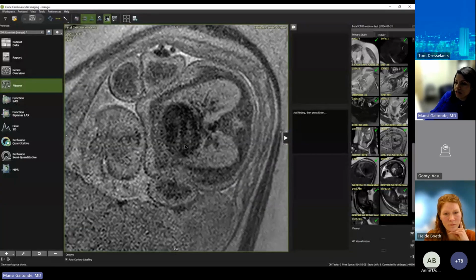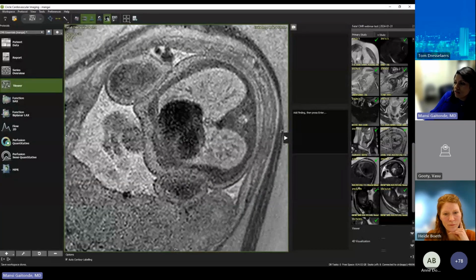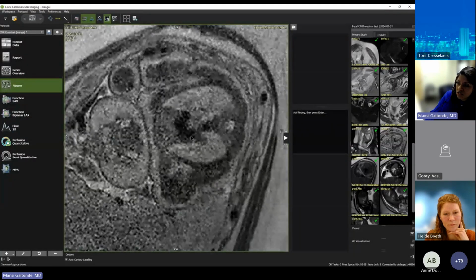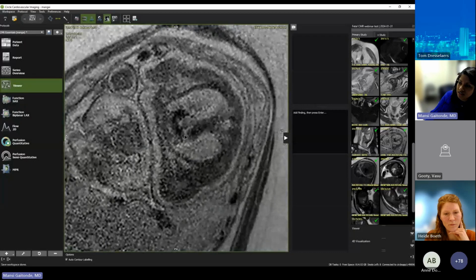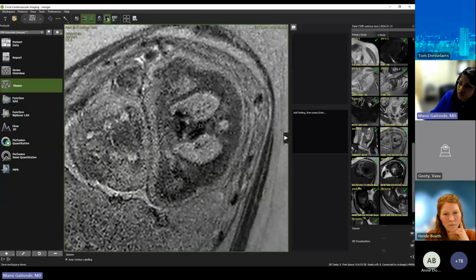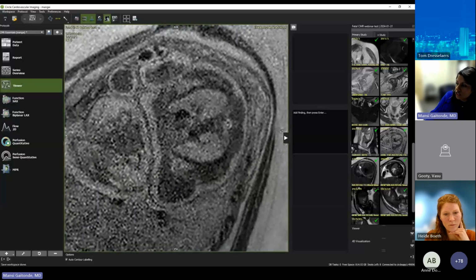We came back to the cardiac images, and again, we're trying to work on getting some black blood stacks. If you're looking in this area and trying to diagnose much, I think we can see a ductal arch, but beyond that, it's not very clear that there's a definitive aortic arch here.